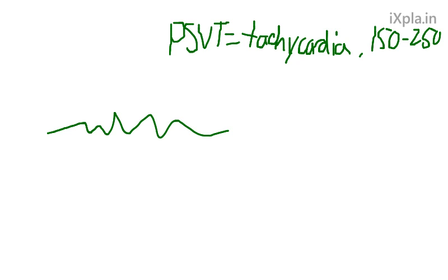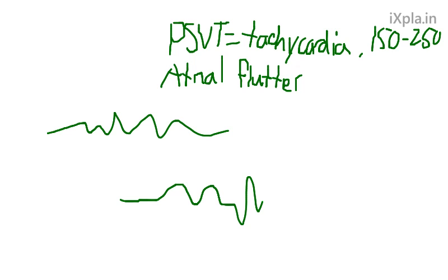Just beats really fast. Now another one is called atrial flutter. Atrial flutter is called a sawtooth pattern. Usually that means the ratio of P waves to QRS complexes is not 1-to-1. So you can have 2 P waves to 1 QRS complex. Look at this. Normally it could be P wave, QRS. P wave, P wave, P wave, QRS. The ratio is off. It's called the sawtooth pattern because that's what it looks like. You'll recognize it when you see an EKG. So you're having many P waves.